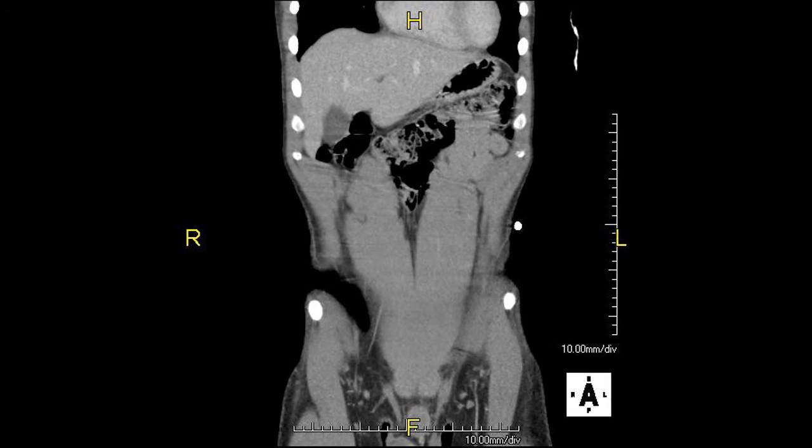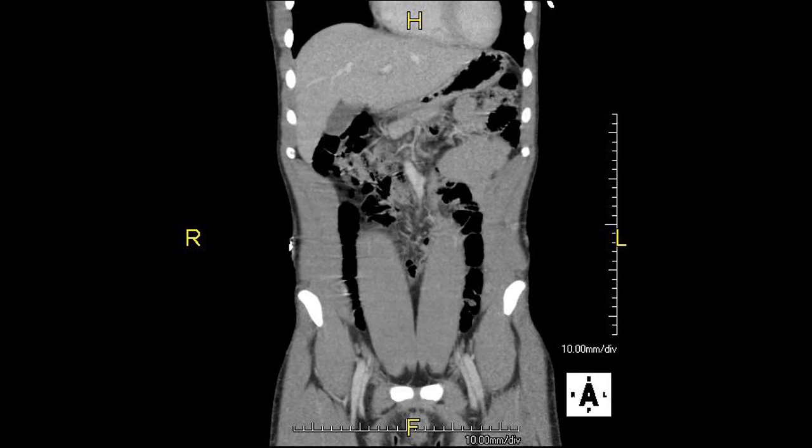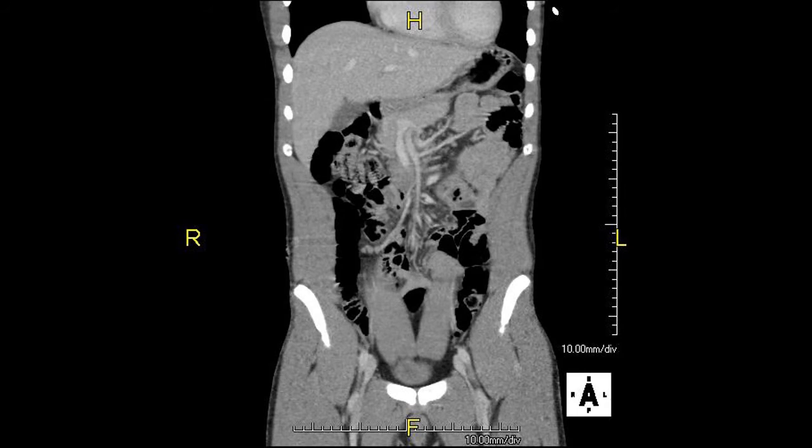Now, I don't usually identify muscles in these presentations, but I want to point out the rectus abdominis here because it is just so prominent in this image. And I'll outline that quickly in yellow. The pancreas becomes visible here, and although it's a little hard to define its boundaries, I'll outline it in blue right here.